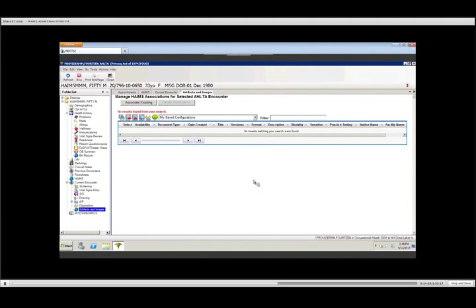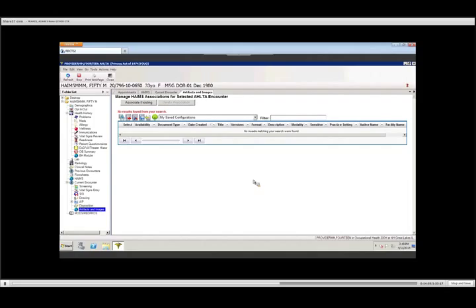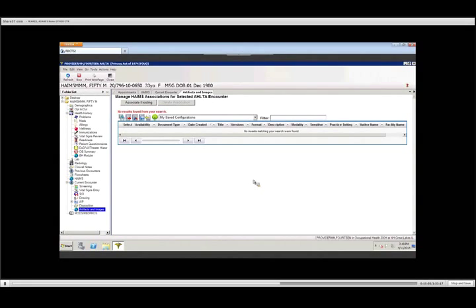Yes, and so if the user deletes it, is there a way to trace who deleted it? There is. Another great question. So the student asked, if someone paperclips an asset, we'll use user Joe. So if Joe paperclips an EKG to an encounter, and 2 days later, Sally goes in and unpaperclips it, there is an audit trail for everything you do inside of HAIMS.